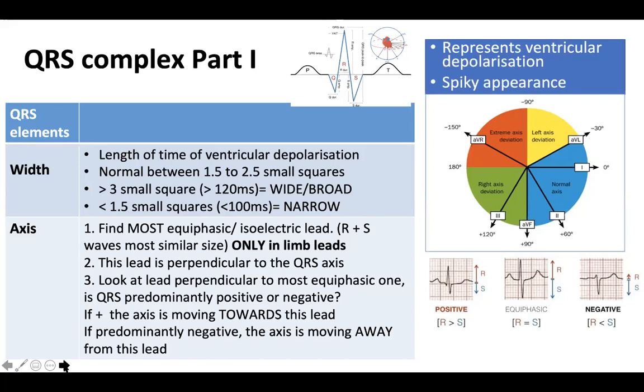In terms of axis, the only method I use is one that I learned in medical school and still use till today.